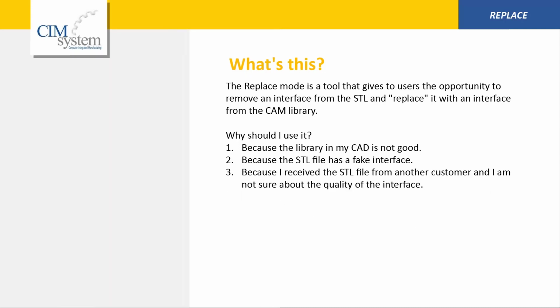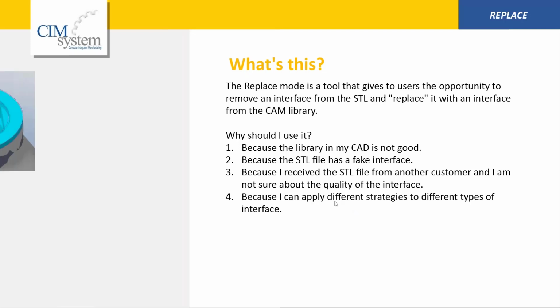Another case, because I received an STL file from another customer, and I'm not sure about the quality of the interface. So changing the interface with the replace system gives me the ability to have a proper connection. Or more important, because I can apply different strategies and tools to different types of interfaces.